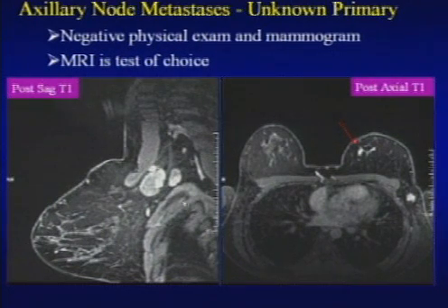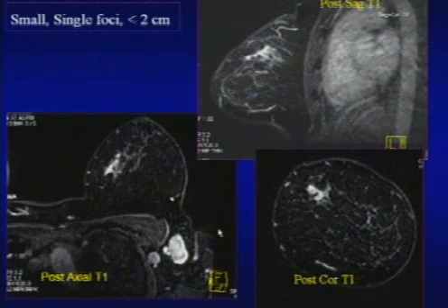This patient presented with a palpable lump in the axilla, and in fact, on MR, we can see that there's actually extensive adenopathy. And when we were imaging this patient, we just saw a slight focal area, which looks a little bit brighter than normal breast tissue. So again, a little bit suspicious. And when we look at all 3 planes, this is a focal area of heterogeneous enhancement. In fact, this turned out to represent the patient's primary tumor.